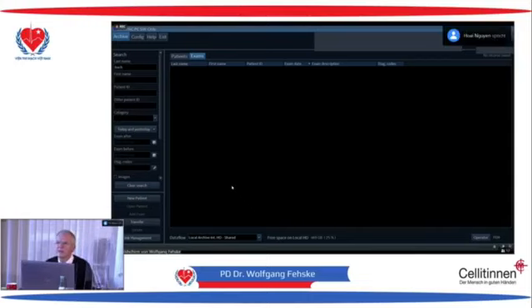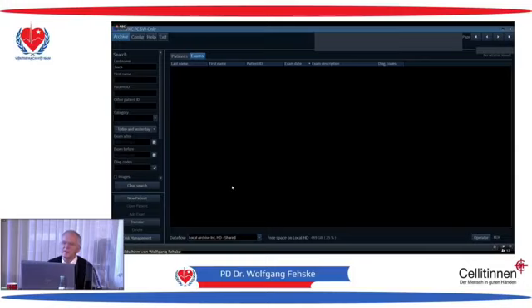The right ventricle does not recover at all. What changes is the paradoxical septal motion, and this normalizes very soon because there is no volume overload, but it's still the only part of the right ventricle which is pumping, at the septum.